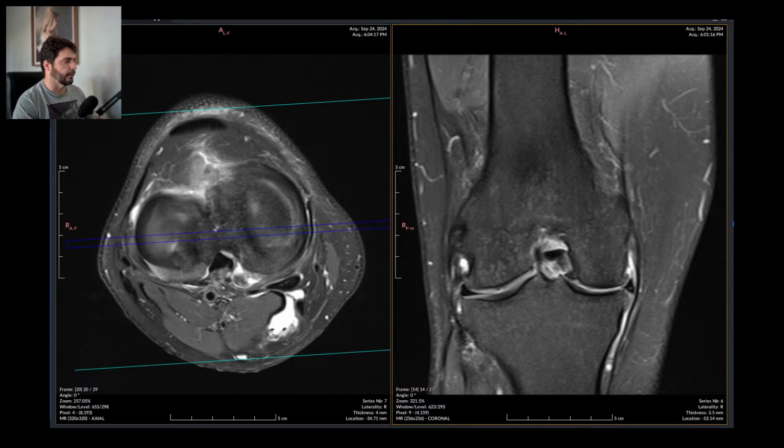Let's go to the next one. So I'll grab another CT scan and then another MRI scan. There are a bunch of CTs already from the emergency, and we could just have a little fun with that.